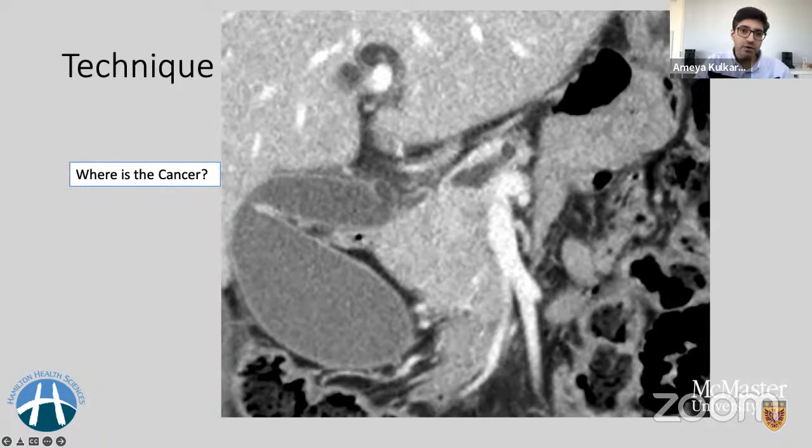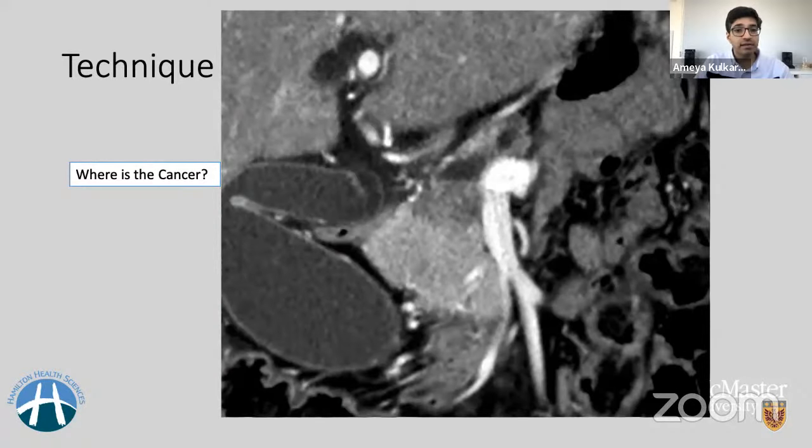The question is that you don't obviously see it because it is so isodense to the pancreatic parenchyma on this portal venous phase. But you do definitely see that this right lateral margin of the superior mesenteric vein is in close proximity to whatever is there in that region. Now look at the difference here. The moment you start doing pancreatic parenchymal phase on top of your portal venous phase, you start to appreciate the difference. This is the same patient, scan performed at the same time.